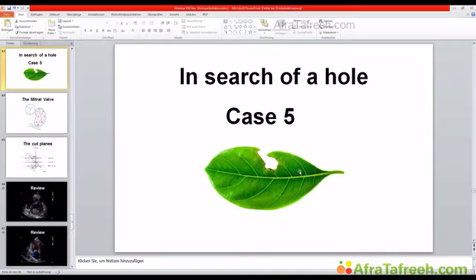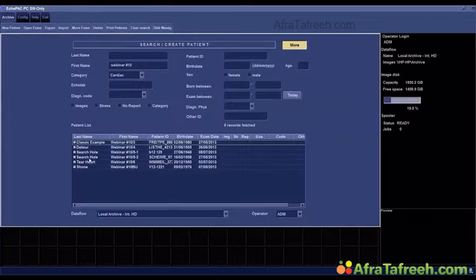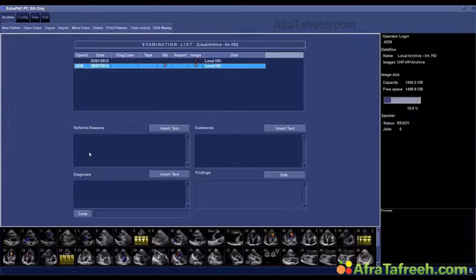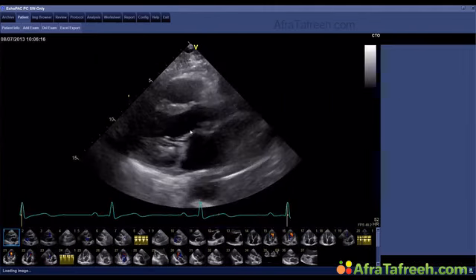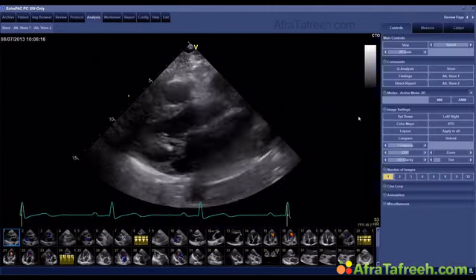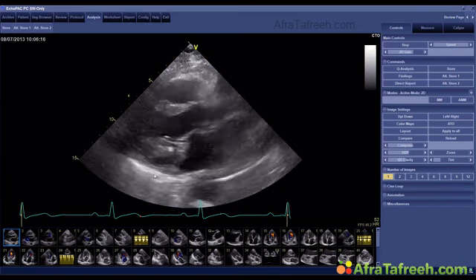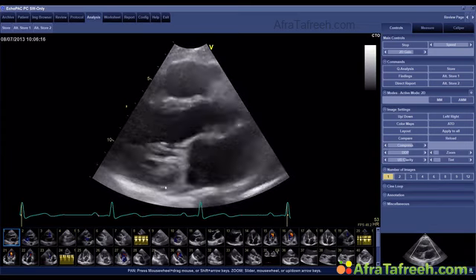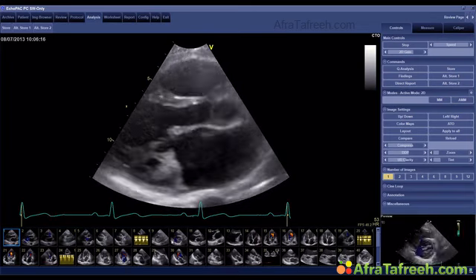Know, at least a teaching case that you should know. What I want to show you now is how you can actually assess the origin of mitral regurgitation. This is a patient, I guess not difficult to detect, who has a problem with the mitral valve, right? Take a look at the mitral valve. You see the texture of the mitral valve.